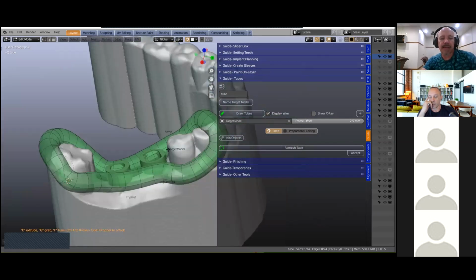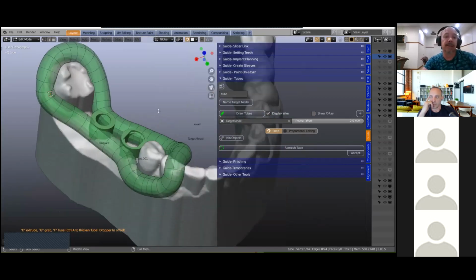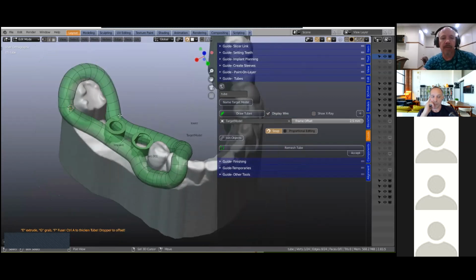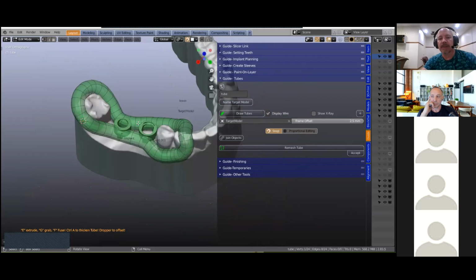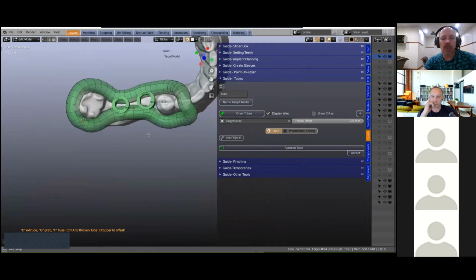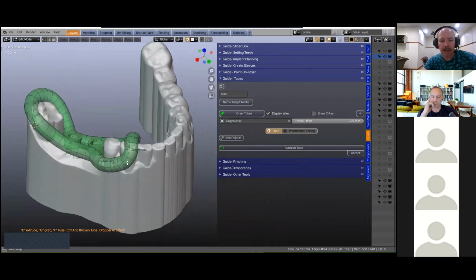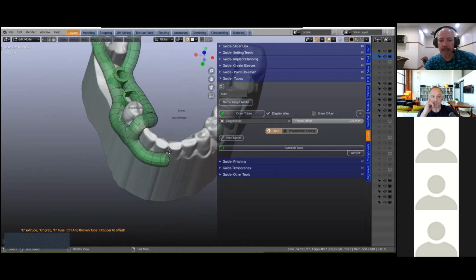Of course you can extend this bigger, and you can join tubes onto tubes or tubes onto layers as well if you want to. Or you can make little rests as well. We've got this all covered in the videos. So let's assume this is okay. Well, actually, ideally we don't want this to move anywhere, but we can add more tubes and so on. Maybe for fun we'll just add another tube here, extend it, and bring this across.